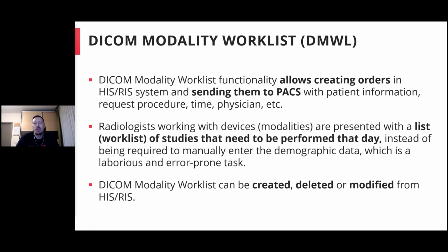And the radiologist who is working with the devices or the modalities is then presented with that list. They see the list of the patients who will be coming for the exams, and they can do these exams simply by selecting the patient from the worklist.